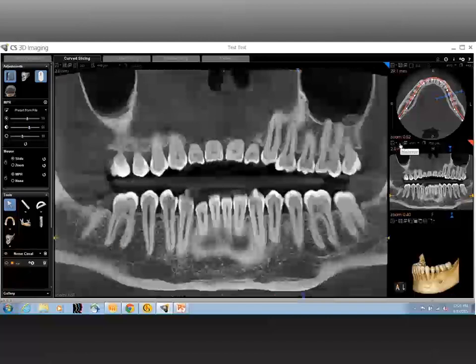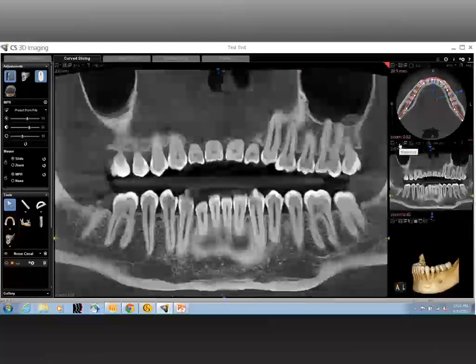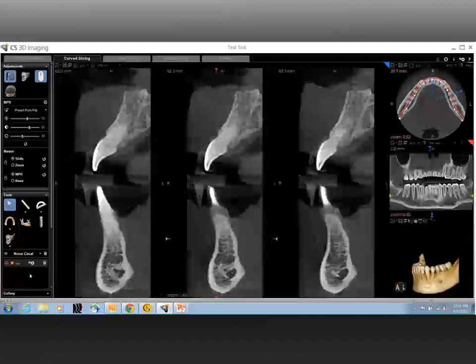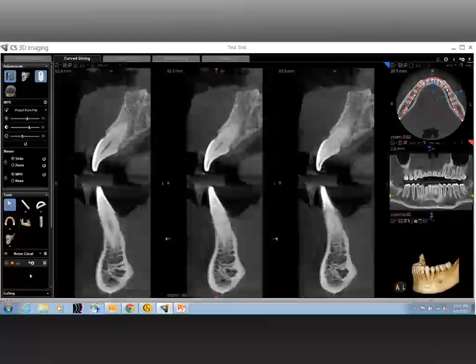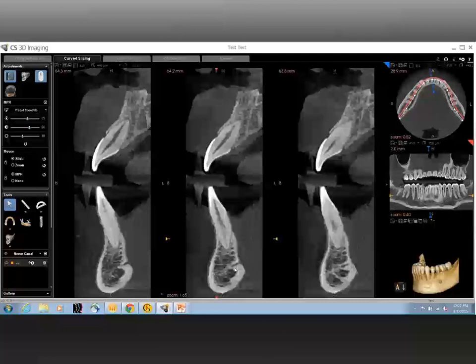You mentioned the lingual foramen. If you would, I believe we'd find the lingual foramen right in the midline in the mandible. If you could show us that also. That is very, very well noted. Let me just scroll around and get to the exact view. That would show the lingual foramen. If you notice, it's just like the name implies. It is on the lingual surface, and that's where it is.